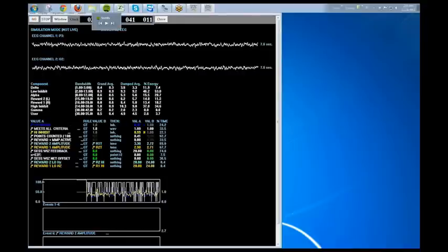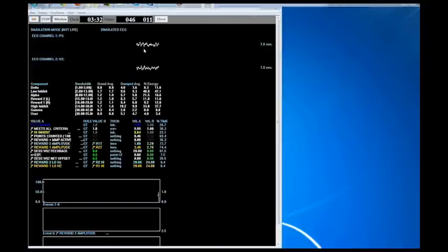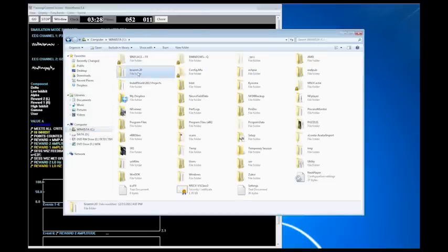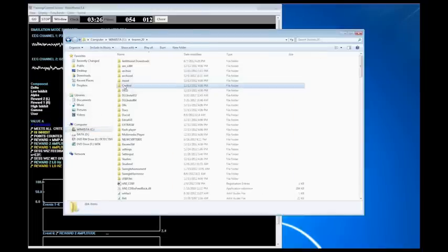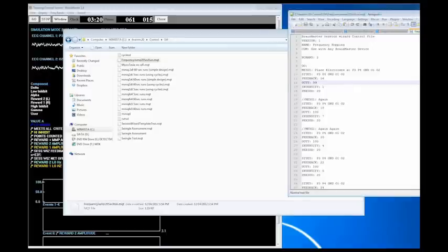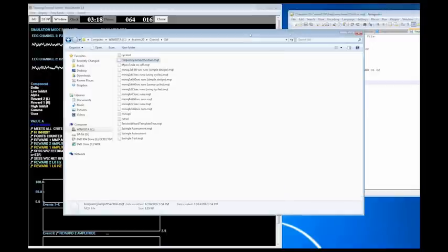Okay, no problem. I will show the SessionWizard file again. Did I close it? I might have. There you go.